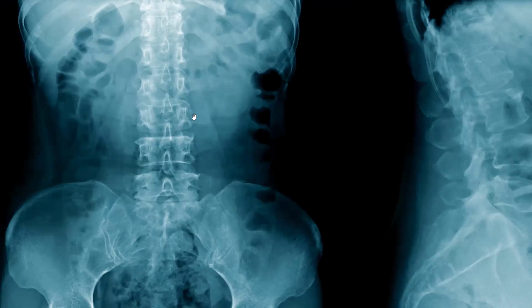Let's talk about the bowel here on this abdominal X-ray. Here we have an AP abdominal radiograph. Okay, and mostly what we're seeing on this view is air in the colon. Okay, and we're going to talk specifically more about the bowel wall.